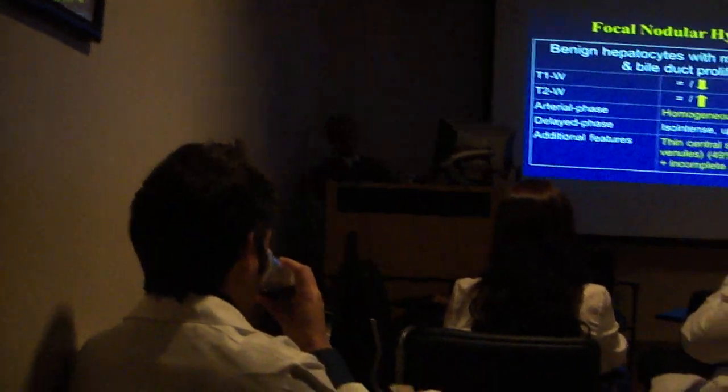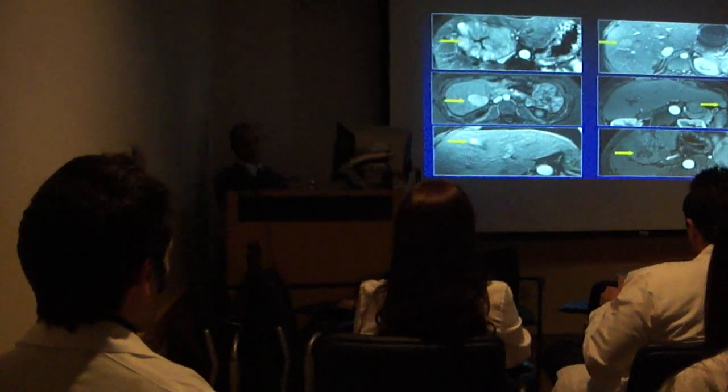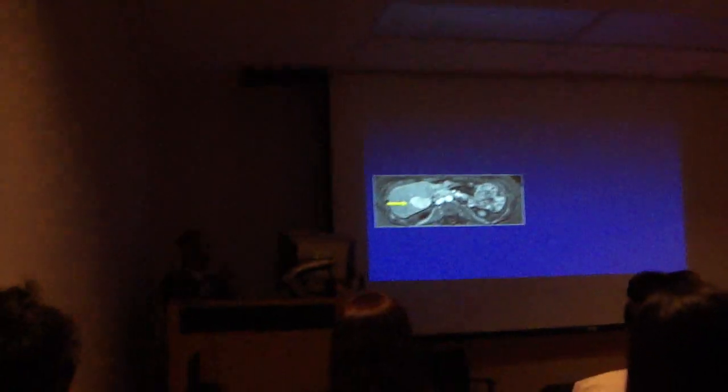Should I go to the next lesion? Okay, good. Everybody with me? Good. Okay. Sorry. See, this is the trouble I had.